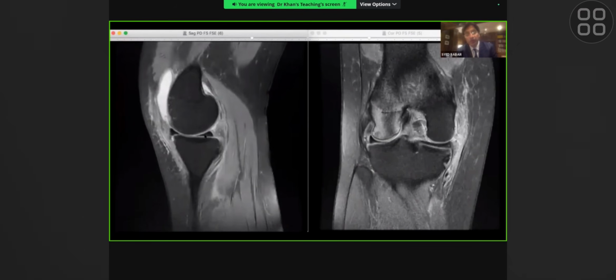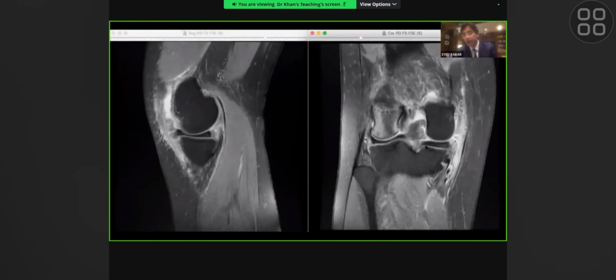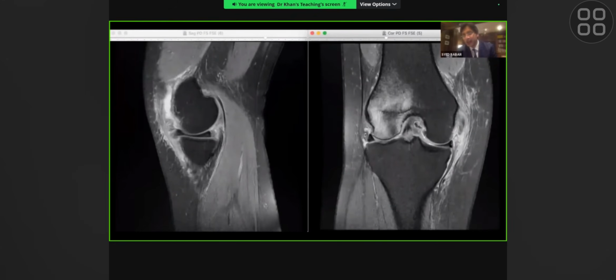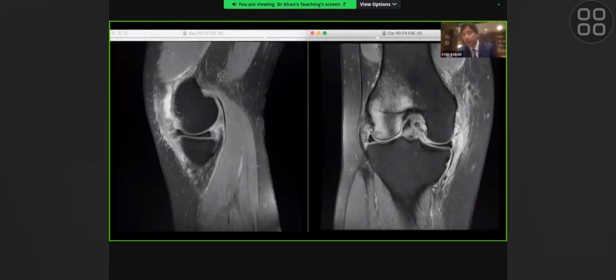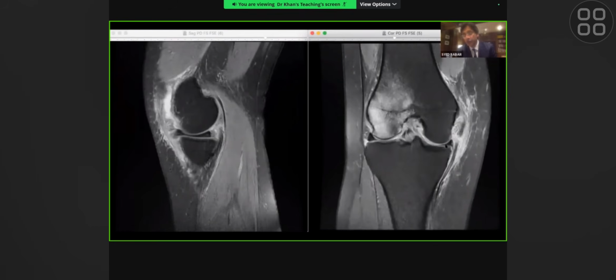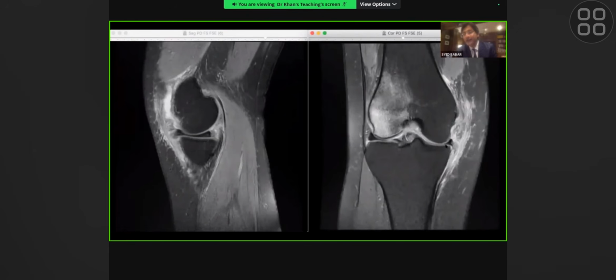You look at the medial meniscus all the way, you confirm the medial meniscus. You can clearly see there's a bit of myxoid degeneration because there's clearly abnormal signal, but it's all centered within the meniscus. It's not going to the articular surface, so you cannot call it a tear. You can certainly call it myxoid degeneration if you want. And of course, why is the meniscus extruded? You kept mentioning that the meniscus seems to be extruded out of the joint, or at least anteriorly. And there's a very good reason why you should be able to justify that statement.